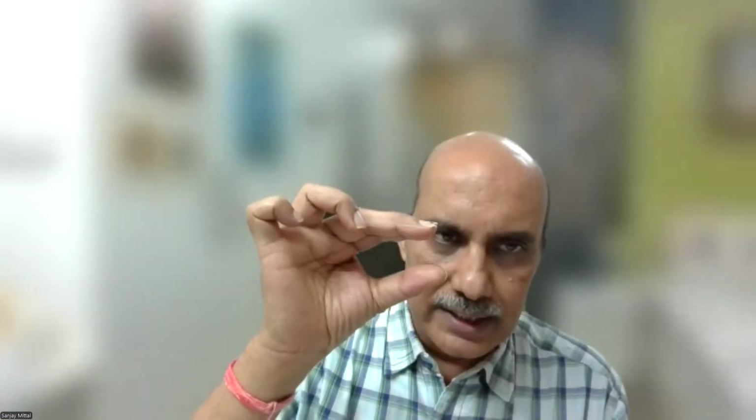But as I was mentioning, it's very difficult to measure the thicknesses. How we practically look at the hypokinesia, akinesia, and dyskinesia is that you have a normal segment, just like most of the examples which I showed you. One segment was contracting well, and the next segment adjoining to that was not contracting as well. This was hypokinetic because I could see that it is contracting. There was change in thickness during systole, but it was not as good as the adjoining segment. This is hypokinetic. If I see no perceptible change in thickness, this is akinesia. If I see there is a paradoxical movement and thinning of that particular segment, this is dyskinesia.